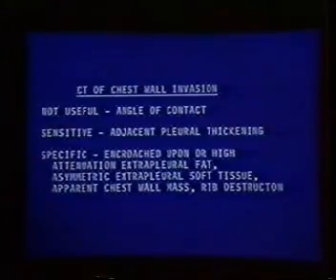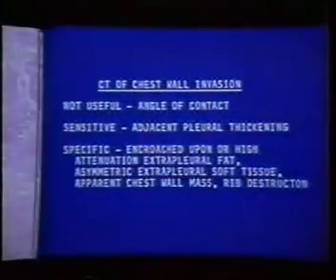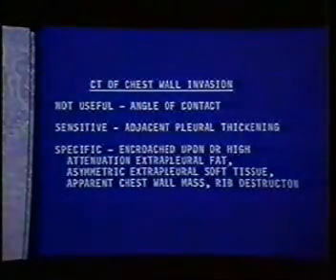I think everybody's come to pretty much the same conclusion. First of all, we looked at the angle of contact with a lesion, assuming that if you had acute angles, for example, that would imply that a peripheral tumor was limited to the lung parenchyma and not invading the pleura or chest wall. And in this case, here are the islands of foci of tumor that are extending into the pleura and chest wall. So angle of contact is not useful at all. It really does not separate patients with disease limited to the lung from those with chest wall invasion.